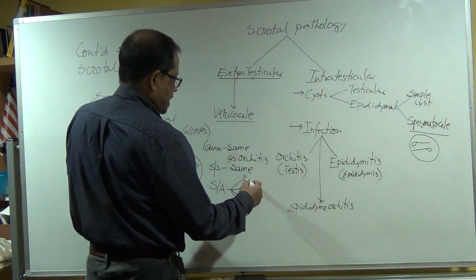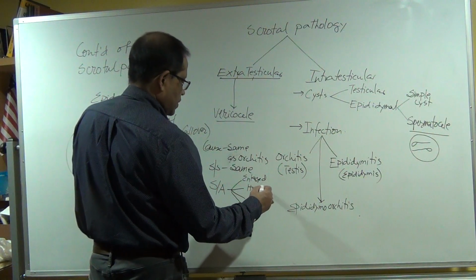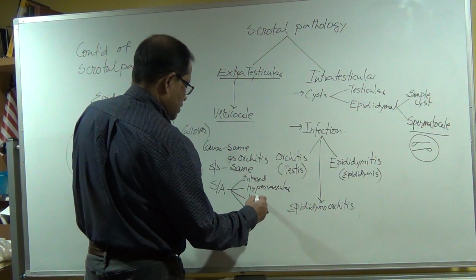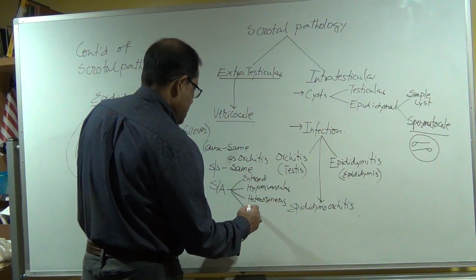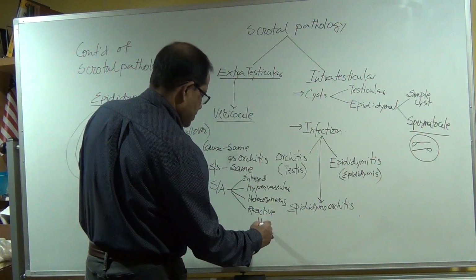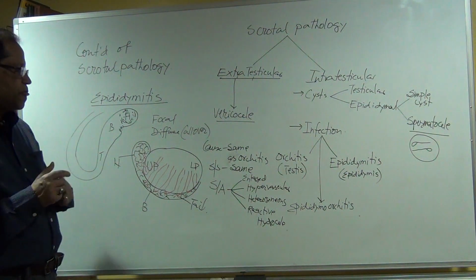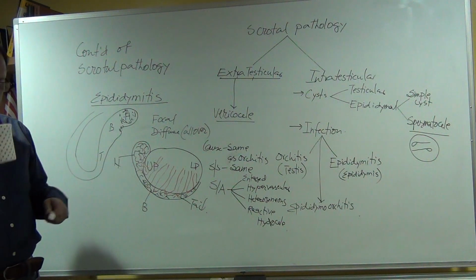So, enlarged, hypervascular, then heterogeneous and reactive hydrocele. Okay, so these are the sono appearance.